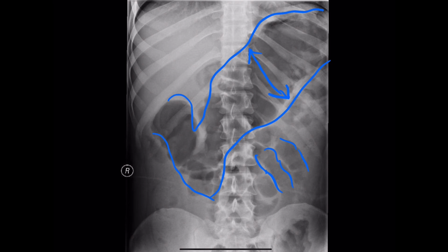So obviously the real concern here is, has this patient perforated? Because that would be an indication for urgent surgery. Okay, I'm being cheeky, but on this plain film, will you be able to call a perforation? So perforation, the real key thing here is that perforations are much better seen on erect chest X-rays. Okay, you really need a large perforation to be evident on an abdominal X-ray. We'll show them in our future tutorials. We'll show them one. But erect chest X-ray, air under the diaphragm. Go and read about it.